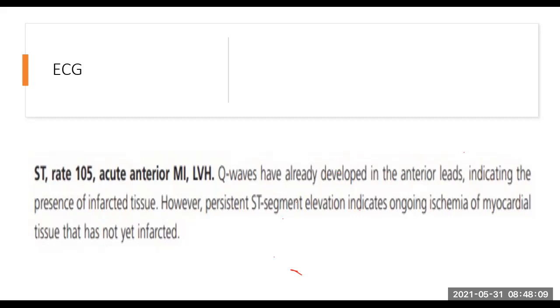Okay. Is this patient having a good or a poor prognosis? Unfortunately, it's not a very good prognosis. The simple reason being, she's infarcted very quickly. She's continuing to infarct. And until we actually reperfuse that tissue, she will continue to get worse and worse and worse. And the more tissue you infarct, the less functional tissue, the less our heart can physically work.